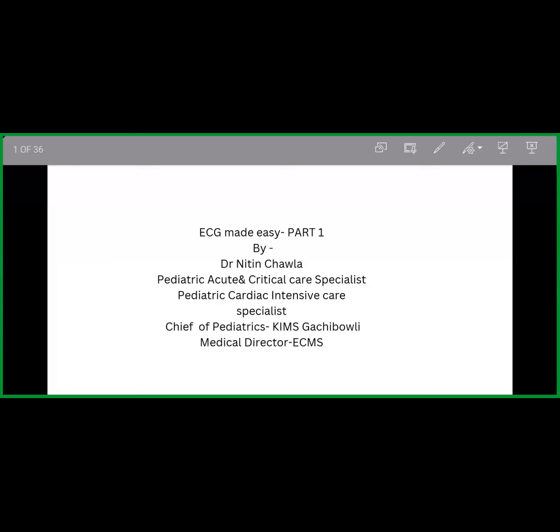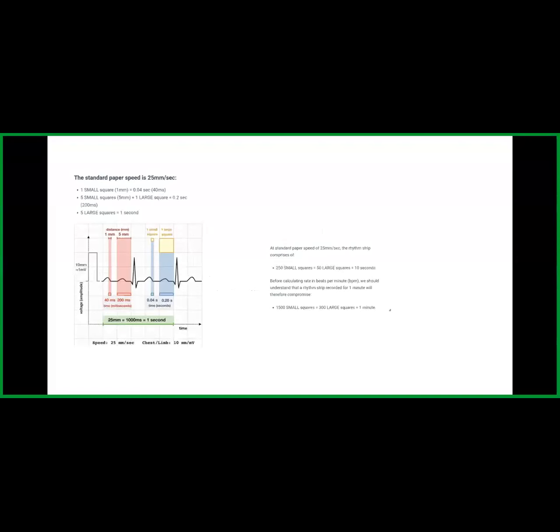and this will be a good add-on to that understanding. So whenever we have an ECG in our hand, we go through this paper, which is the ECG paper. It is a very relevant document to assess any child who is coming to you in any kind of emergency. And when you hold an ECG paper, there are two most important aspects.